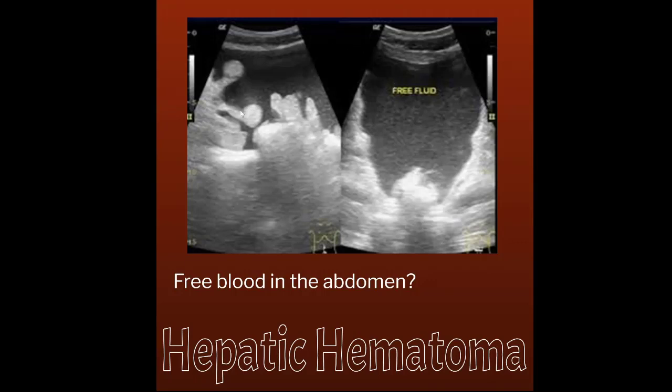So, if this was on a patient that just got in an accident and we're seeing all this kind of complex fluid out in the bowel, we might be more concerned that this is actually hemorrhaging from somewhere. Compare that then to the patient who maybe just has a history of cancer, then we're less likely going to be concerned about this being blood. So again, history is so important for which direction our differential diagnoses will go.